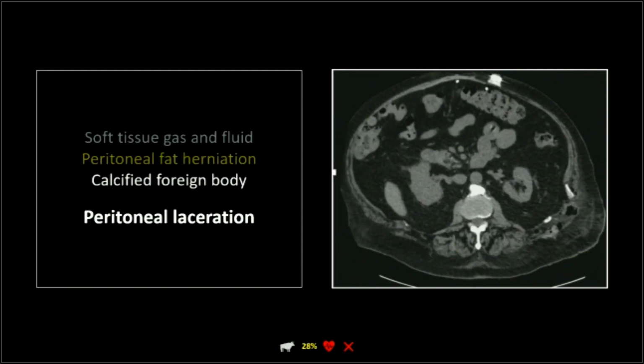So the other thing that's amazing here is that calcification. So this came to me through QA. I opened this up, and this had been submitted as a QA, and the on-site physician had typed "missed rib fracture." So this was immediately, and thank you, Ed, for this.